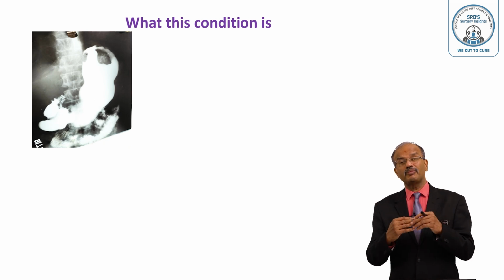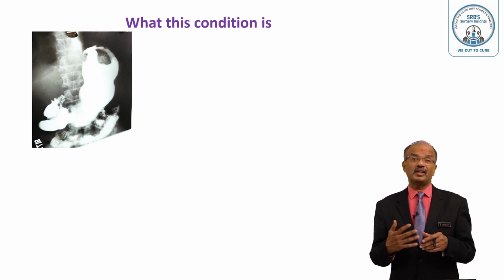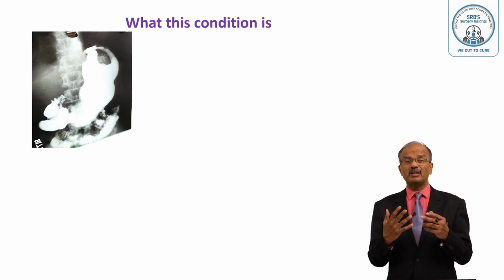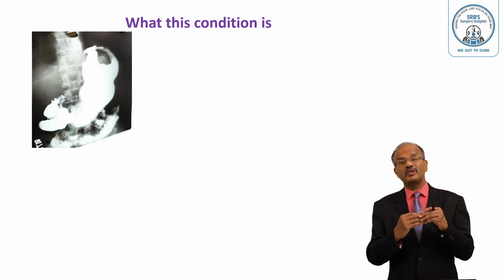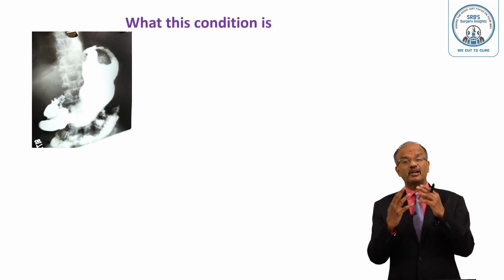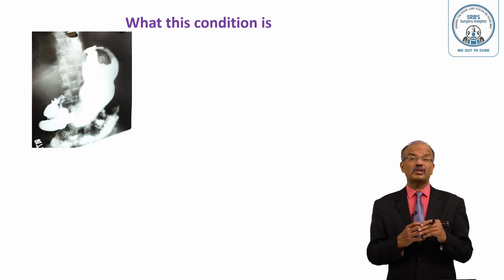Sometimes an air contrast barium meal study will also be done. Ask the patient to inflate the stomach with air, then you can do an air contrast barium study. In the traditional barium meal, it is not necessary. You can see trifoliate duodenal ulcer, absence of duodenal cap will be there. Trifoliate duodenum can be seen in a complicated chronic duodenal ulcer. Then irregular filling defect in carcinoma of stomach. In stenosis, the dye will not enter the second part of the duodenum.